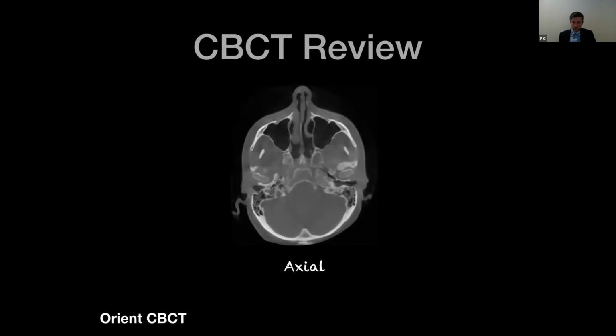You just right click and you can rotate the patient forward. Other software should have this capability as well, but eventually you can turn the patient forward and evaluate for symmetry. Again, we see our imaginary line here, and we've just oriented that patient in the axial plane.